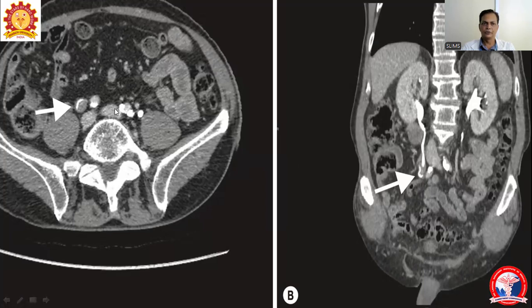We are seeing another case of urothelial carcinoma. Here we are seeing partial obstruction. The whiter denser area is representing urine in the ureter. Since there is a partial obstruction, some amount of urine is passing through it, and just toward the center of the crescent, there is a soft tissue mass, and that is what is important diagnostically, that is urothelial carcinoma of the ureter.